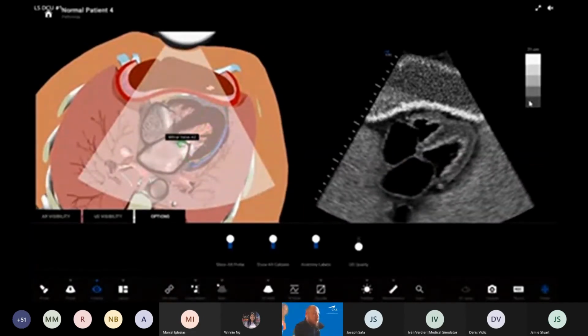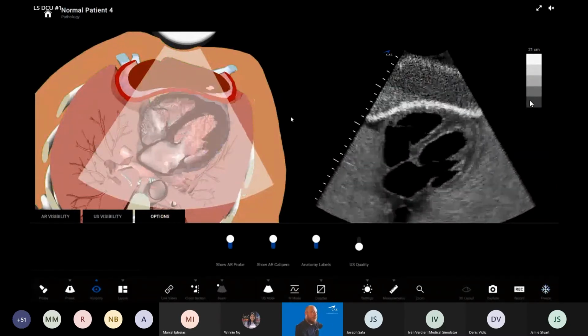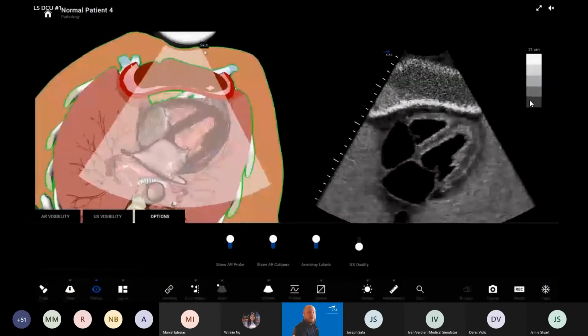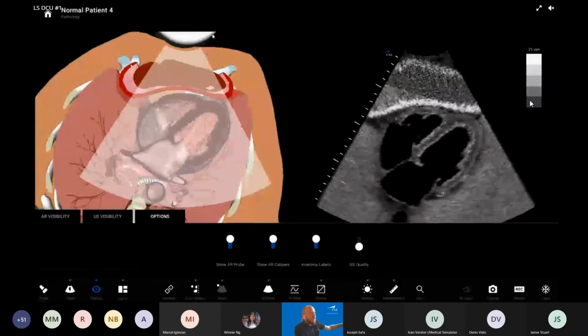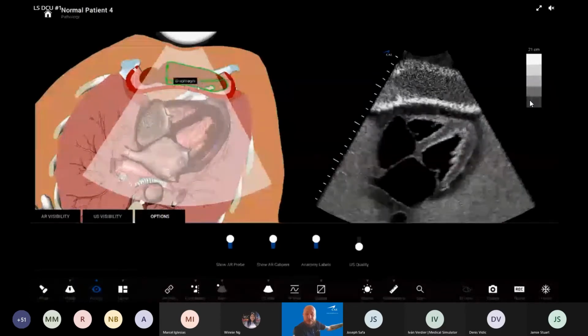You can see mitral valve, P3, A2, A1. So all commissural and valve parts are highlighted. So it's even more detailed than it was, okay? So this is our new quality for heart, and it's in normal 4 patient. So this is the first improvement for 3.2 I told you about. We'll just keep this off.